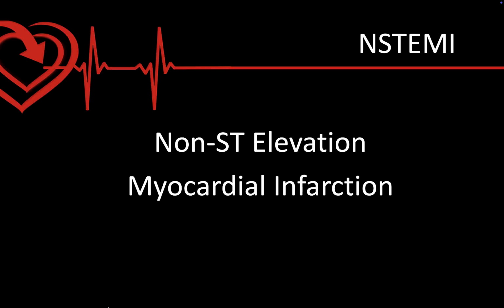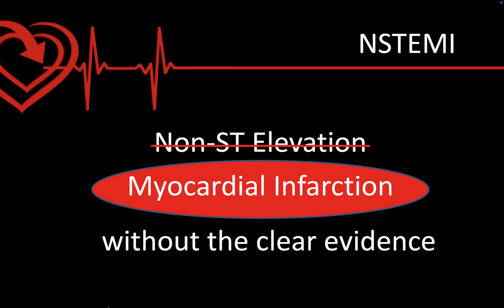The next category I want to talk about is NSTEMI, or non-ST elevation MI. And this is a little confusing for some people. This is not a non-MI. This is not saying the patient isn't having an MI. This is saying this is a myocardial infarction, but I don't have the clear evidence that an ST elevation would give me.